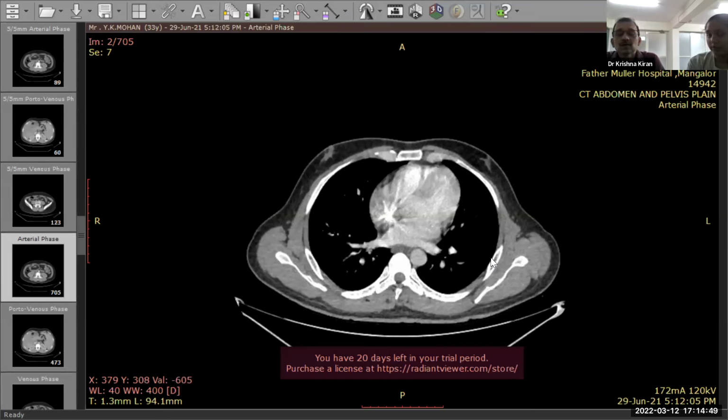Okay. So the early arterial phase, what is the time period? 15 to 20 seconds after injection, sir. In this, we see only the arteries opacified, so we can see the arterial anatomy. Then is the late arterial phase, and this is around 30 to 45 seconds.